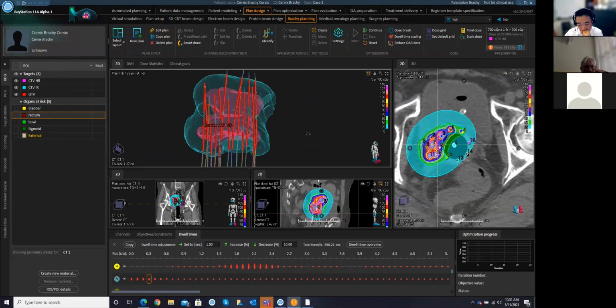I wanted to circle back on one of the questions that were asked before about swelling, and I'm assuming you're talking about HDR prostates and stuff like that. We do have the ability to re-image and then do a deformation, but we could also replan on the new image set to see what's going on, and if you have to deform and map structures and map everything over, we can do that as well.